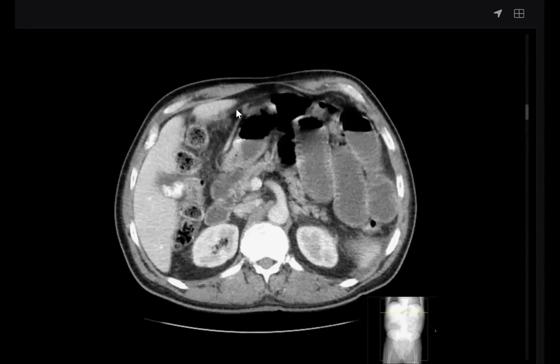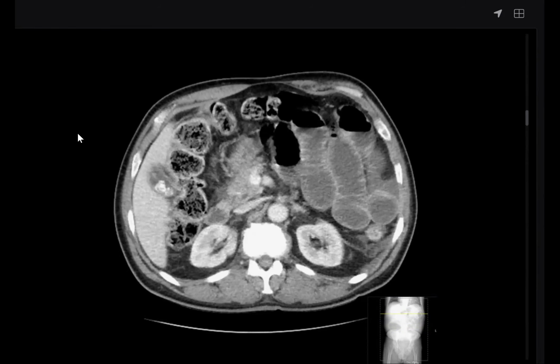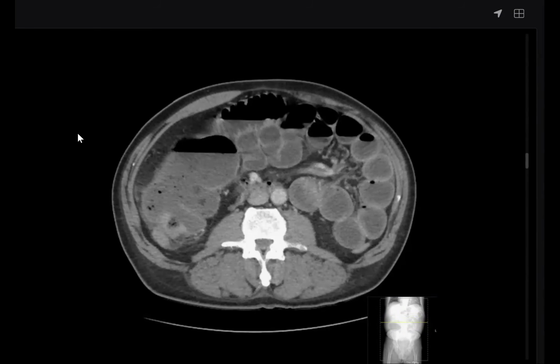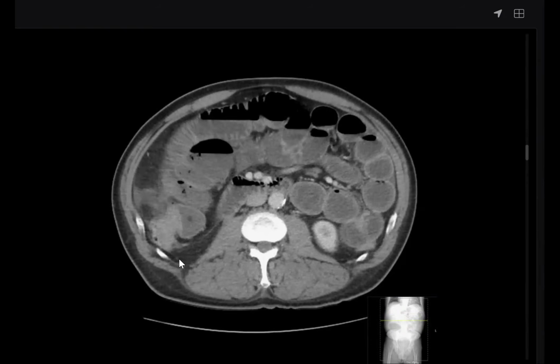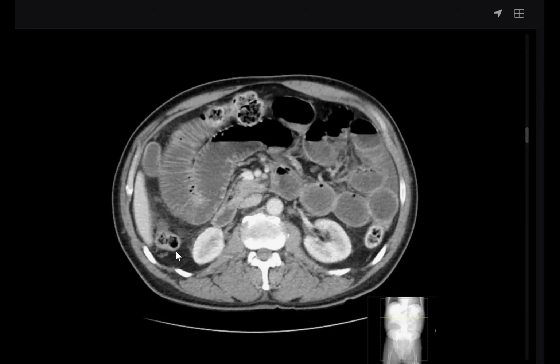Okay, yes, give me the control. What else should you look for in general in case of small bowel obstruction? The causes of small bowel obstruction include gallstone ileus, which I have ruled out. I didn't find any surgical staples, and no evidence of hernia.